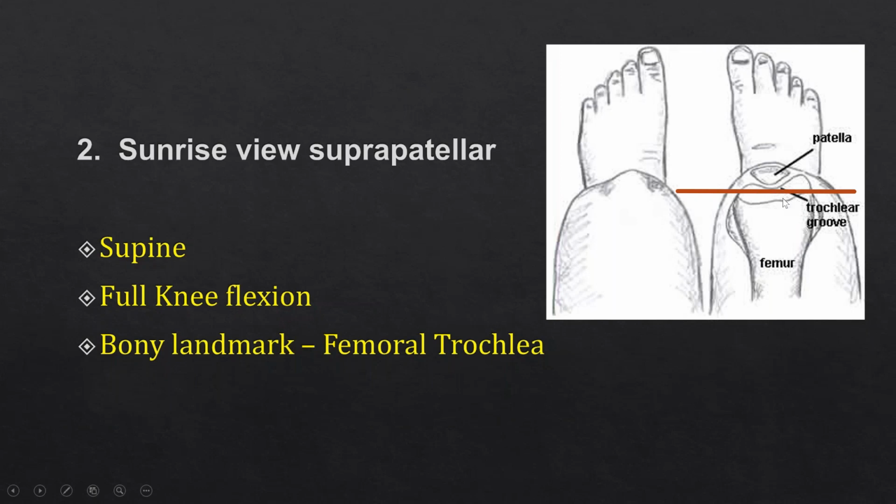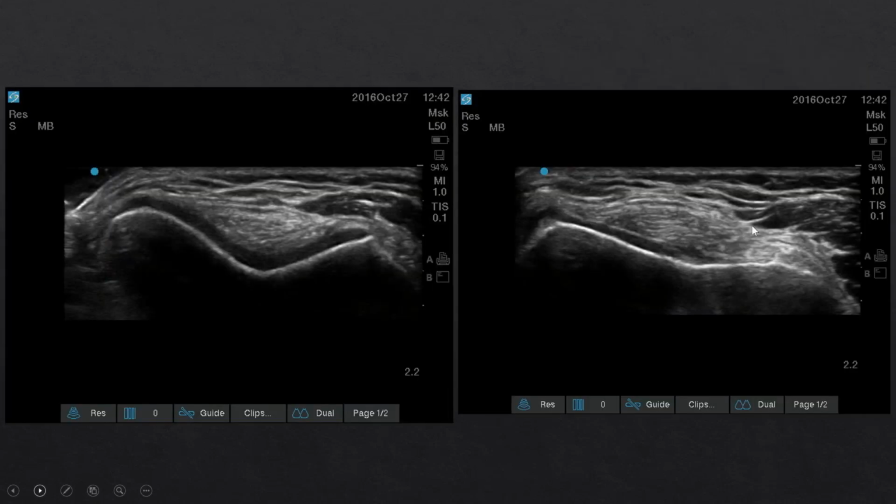So you're not getting the whole view of the cartilage. Look on the right side, you don't have cartilage here, so you're missing this part of the cartilage. That's the reason for this view, although this knee is normal. But if you look at this image and you're not the one who's scanning the knee, you will say this is an abnormal trochlear cartilage.